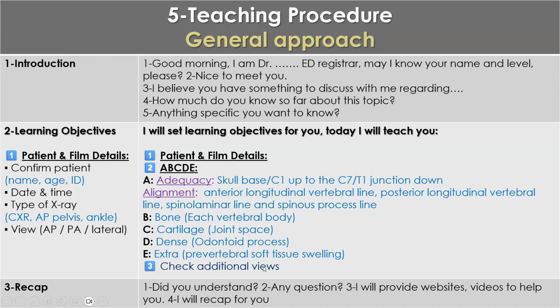Check the additional views, sir. Like what? Like the anterior view, the odontoid peg view, sir, and CT scans. Why? To check for what? To check for C1 and C2 fracture, sir. Okay, excellent.